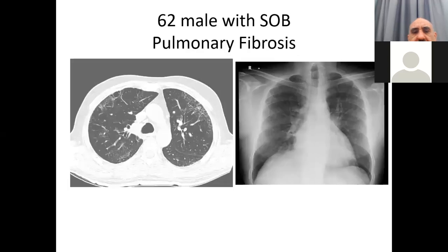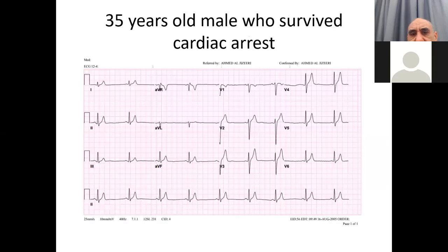Let us take another X-ray finding of a gentleman who has chronic shortness of breath, and the CT scan findings show a honeycomb appearance of pulmonary fibrosis. We can appreciate that there is pulmonary fibrosis.